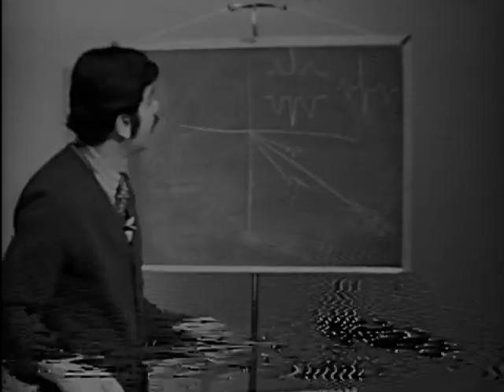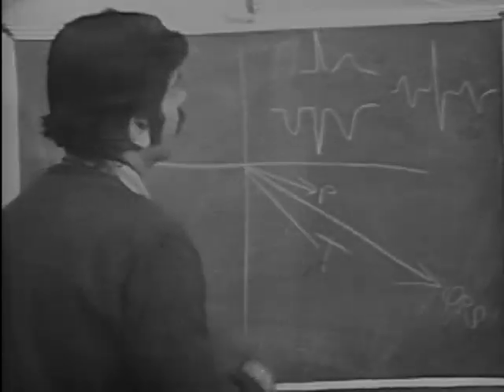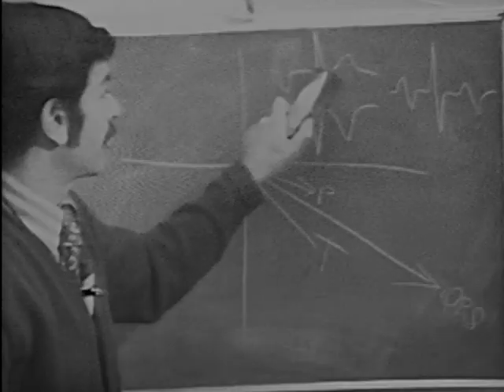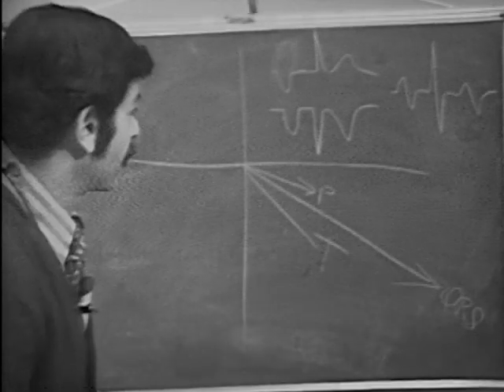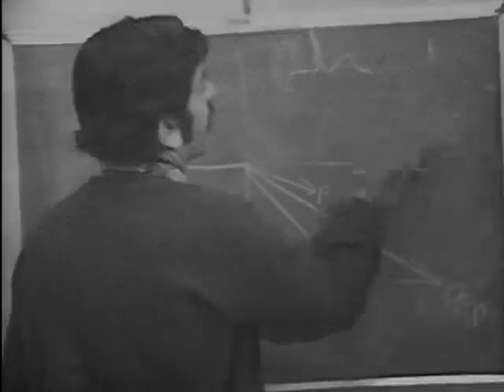It's when you see a discrepancy that there's something abnormal. You can't say what the abnormality is at this point. You just say there's something abnormal. There's either something wrong with this P wave or there's something wrong with both the QRS and the T. But the point is that roughly all of these vectors should be going in the same direction.